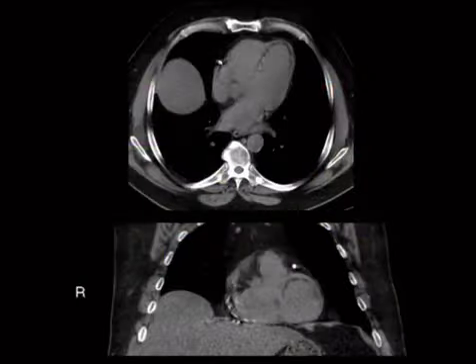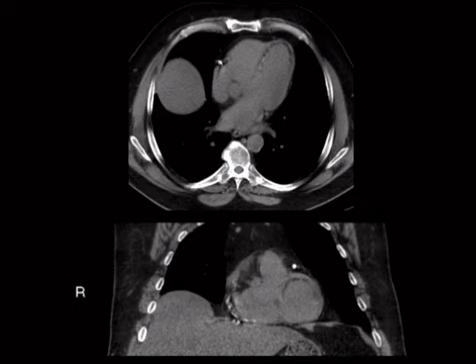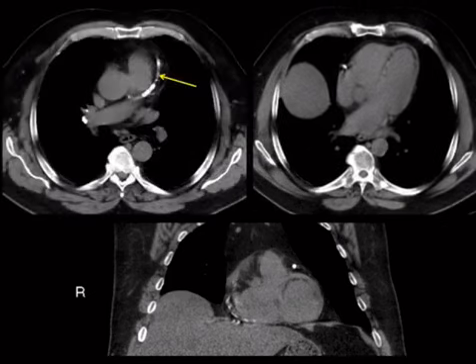So here's a cardiac case, and it's listed as a this versus that. There is the finding, which is this subendocardial fat, which you probably know is seen in the setting of a prior MI. The reason it's a this versus that is that I want you to tell me what is the vascular distribution. What vessel had the MI? And the answer is that this is classic LAD distribution.